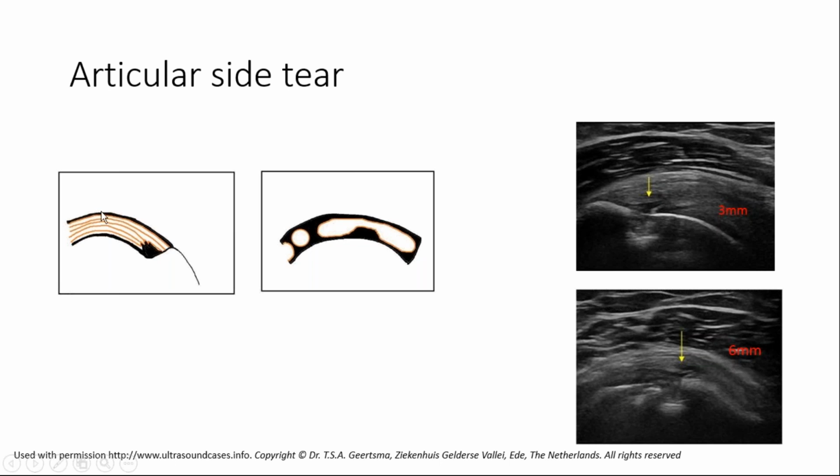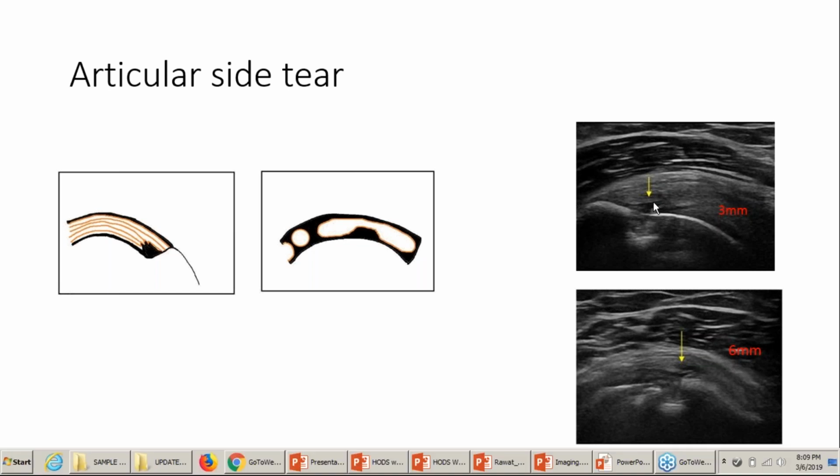This is where the bursa is. So failure of fiber on the articular side, the deeper side of the tendon, is the articular side. If the fiber failure is on the superficial side or the top side, that's the bursal side, because the bursa overlies the supraspinatus and the articular cartilage is deeper to the supraspinatus. So that's how they're localized, based on where the focal defect is located.